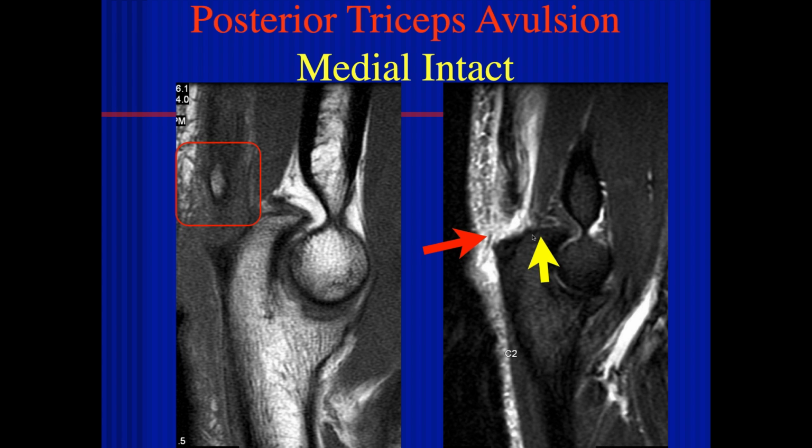Yeah. This has kind of an older appearance also. For some reason, it looks older to me. How about you, John? Yeah, I think so. There's a little bit of chronicity here. It probably had been an injury before.